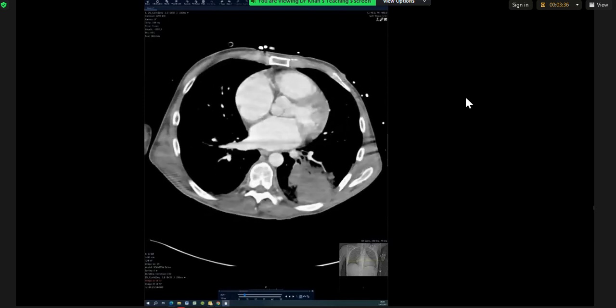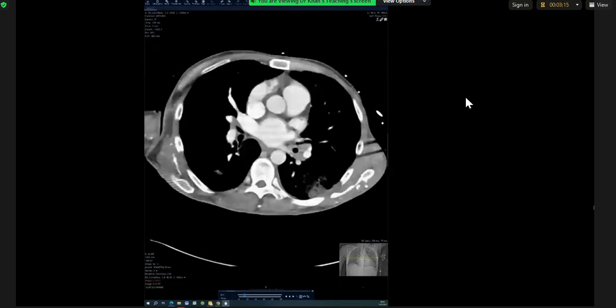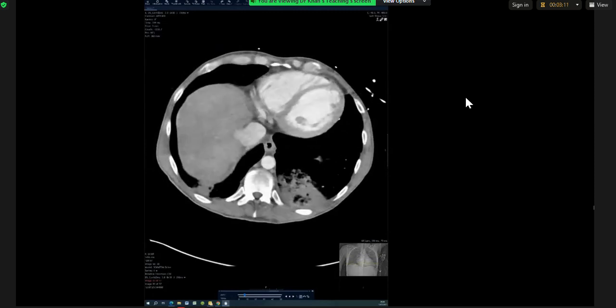So in summary, there are pulmonary and renal infarcts. In a patient with heart failure, I would be worried about thromboembolic causes, such as atrial fibrillation or an irregular heart rhythm. I would interrogate the heart to exclude atrial septal defects or any other abnormality, but I can't appreciate that.